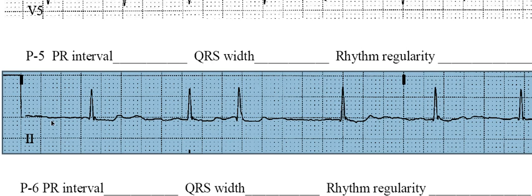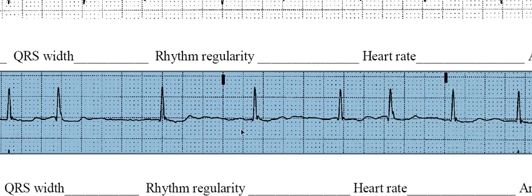Okay, I am looking for a P wave. I see a bump there, I see a bump there, but they are not in the same place. This bump is over here, and this bump is here. Looking for more bumps. Oh, I get a bump there, there, and there. I don't really have a bump here. There was a bump way over here, and nothing there. And this kind of goes down, and then it goes up, and this goes up and up. And this kind of goes down, and this kind of goes down.